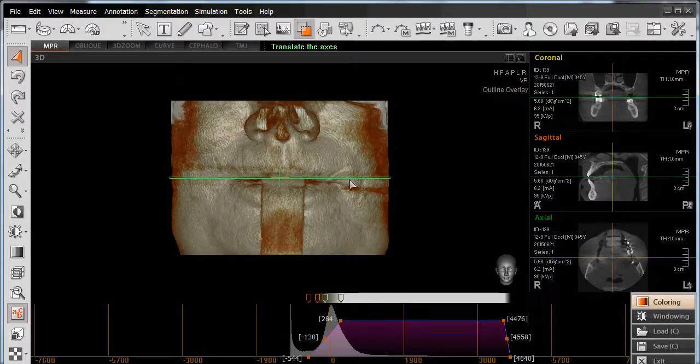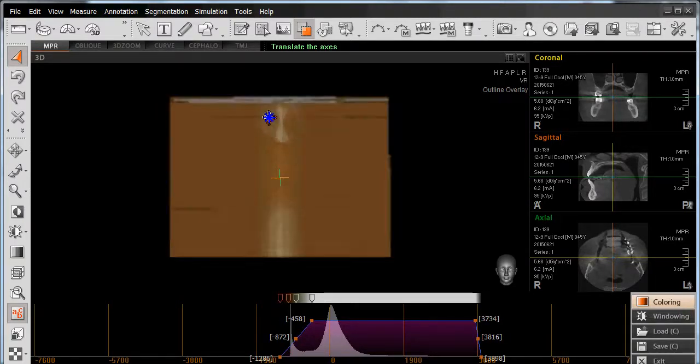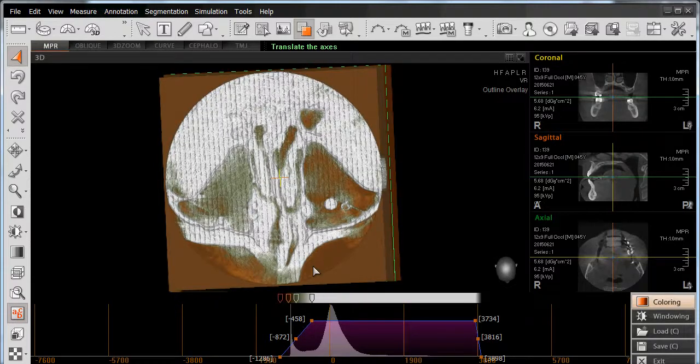In this case here, you'll note that I've added more soft tissue to my view here. At this point in time, I've set the value to negative 544, which is less than the density of skin or the soft tissue, which is what I'm seeing, but now down to the equivalency of air. As I left click and go further, now I'm getting out to the point where I've gone beyond the density of air, and if I right click, you now see this is my data itself.